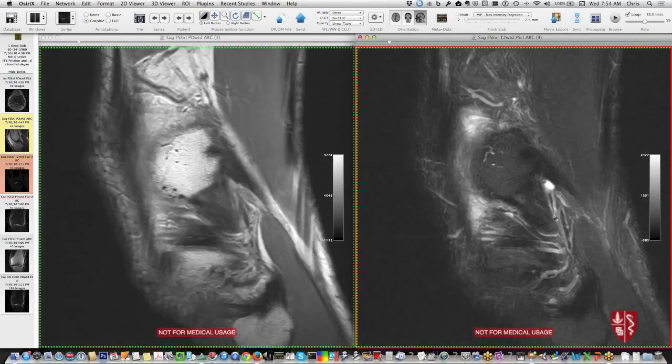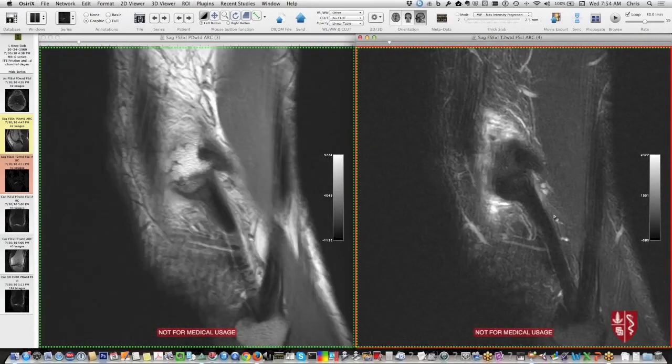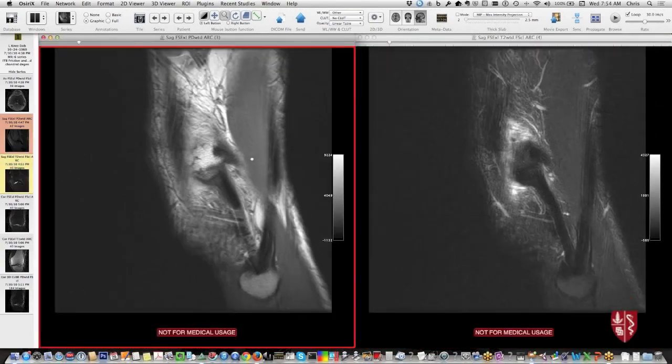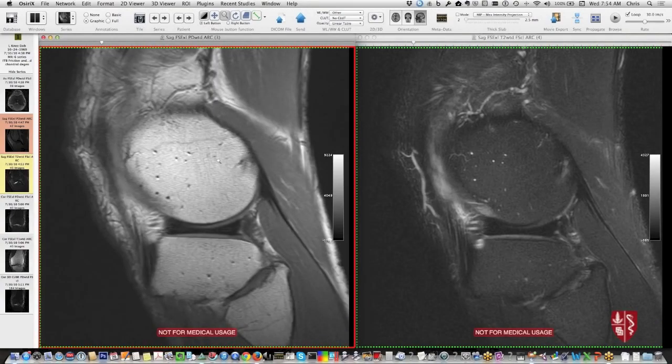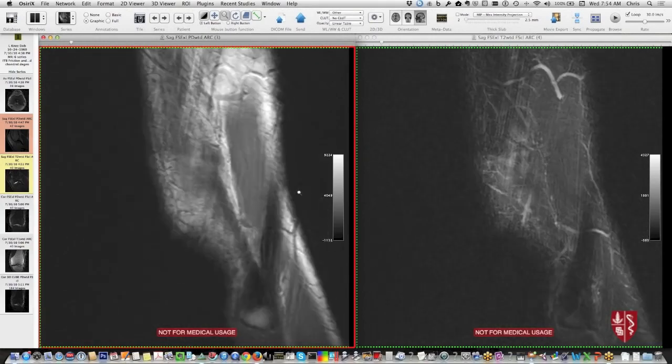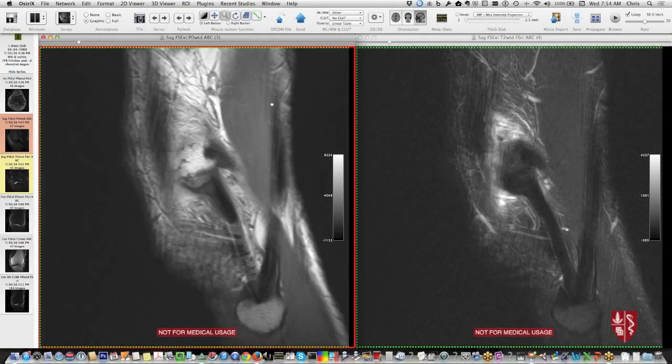Okay. I don't usually spend time looking at this, but when we get way out laterally here, it's a nice view where you can actually see the orientation of the fibular collateral ligament. So here we are very laterally: femur, tibia, fibula, and as we're posterior, this is going to be the biceps femoris muscle and tendon coming down to the fibula here, and this right here is going to be the fibular collateral ligament.